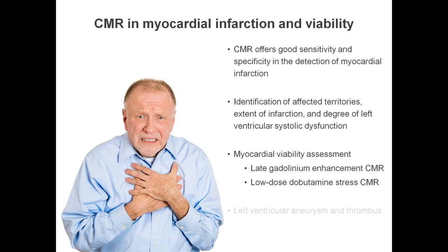We can also assess the viability of the remaining myocardium either using late gadolinium enhancement CMR or low-dose dobutamine stress CMR. And we can also identify complications of myocardial infarction, such as left ventricular aneurysm and thrombus.